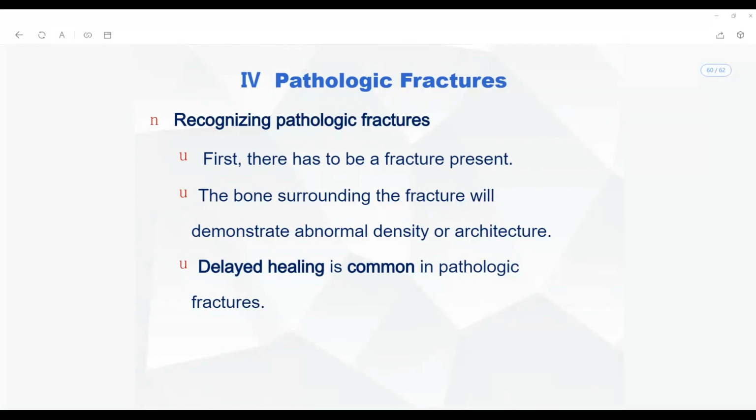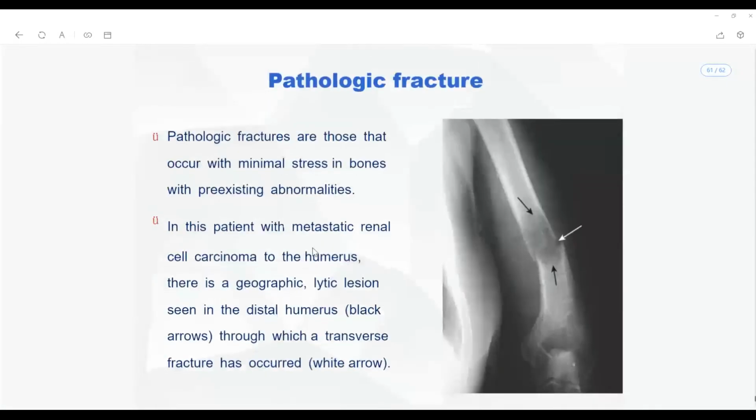And you see here, this is a pathological fracture that is happening along what bone? Can you take a guess? What is this bone that is being shown here? Okay, which part of the humerus? It is the distal end of the humerus. We are looking around the cubital joint region here. How can I recognize it? Yes, it is the shaft, particularly the distal shaft.